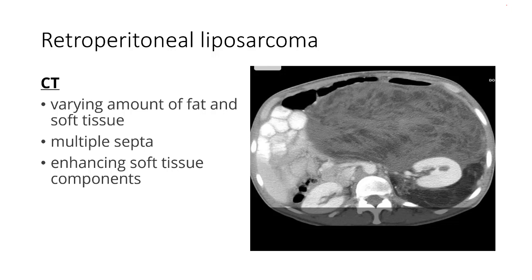Third differential, we have retroperitoneal liposarcoma arising from the retroperitoneal areas. Why retroperitoneal liposarcomas? I'm showing you a picture of how a retroperitoneal liposarcoma should look. This is a contrast-enhanced CT image, axial section. We are able to see the kidneys here, one kidney, the other kidney is here. This is the vertebra, these are the ribs, some of the bowels.